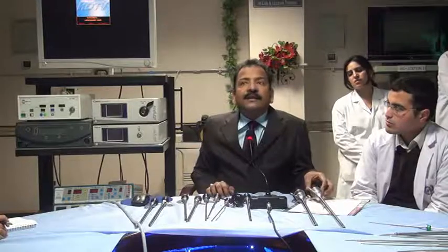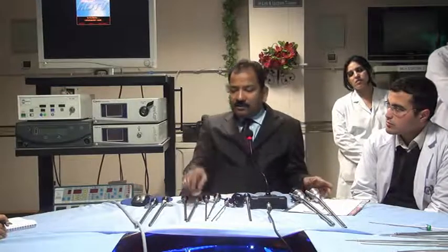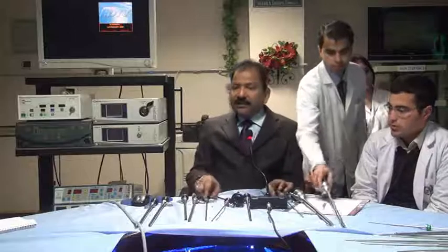So it is seeing in this direction. It is not showing straight; it is showing like that. So this is 30 degree, an oblique cut, and in 0 degree it is a perpendicular cut. The optical axis of this one is 0 and this is 30.